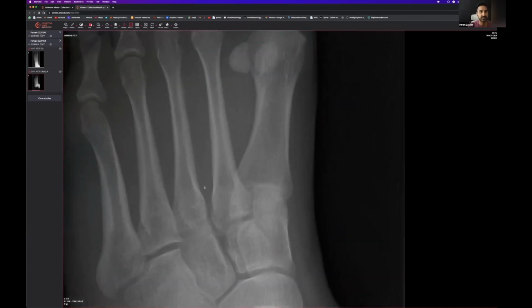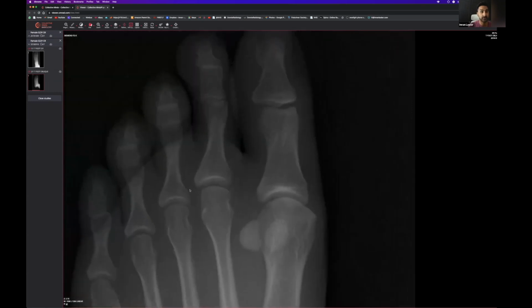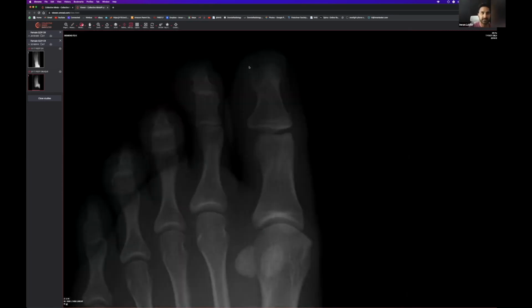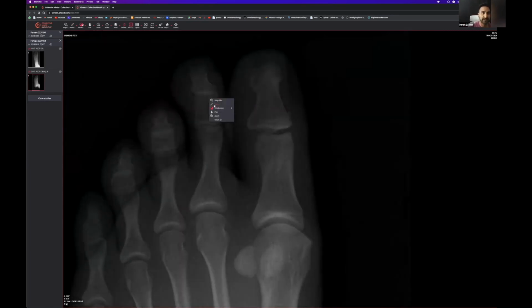Next check area, and I've got a few more check areas, is the terminal tufts. And this is a common problem. For those of you who may have watched the previous talks, people would assume it's soft tissue overlying everything, which is fine. In this particular situation, it is. But people sometimes don't realize that there is the nail bed. So sometimes you can just see the faint outline of the nail sitting like this, okay?